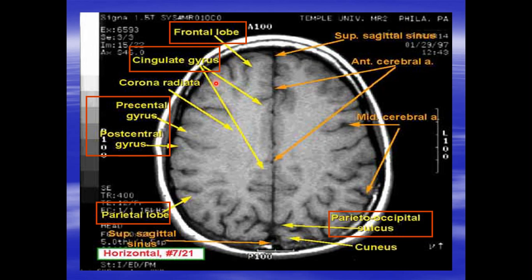This is the first thing. The second thing, you have these sulci, each of them has a name. So first of all, this is the frontal lobe. As we said, it extends from the frontal pole to the central sulcus. So this is the central sulcus, and you can see that the frontal lobe is big because it contains all of our personality. It's mainly the thinking part of our brain, and that's why it's big in humans, while it's much smaller in other animals.